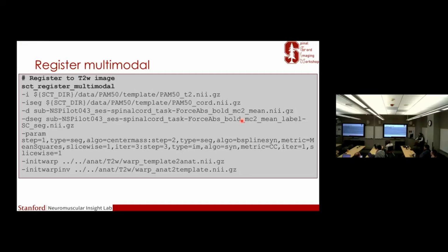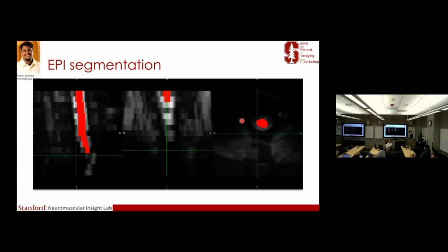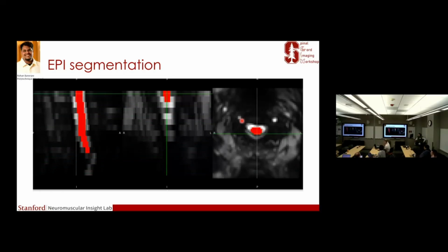And then, can I interrupt? Yes. Okay. I just want to point out that the spinal cord contrast agnostic model for the structural imaging, and now having EPI-SEG, has almost fully automated these analyses. At least, well, there is still need for manual touch-up, but it has really reduced the cost of doing these analyses, because we could spend hours coloring in these spinal cords.